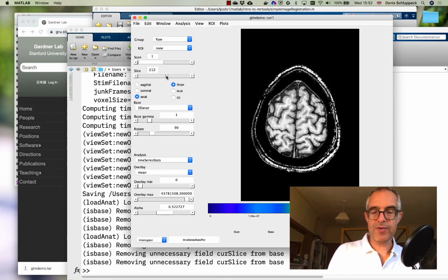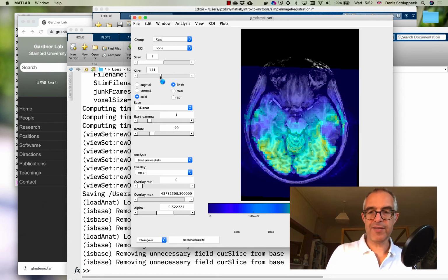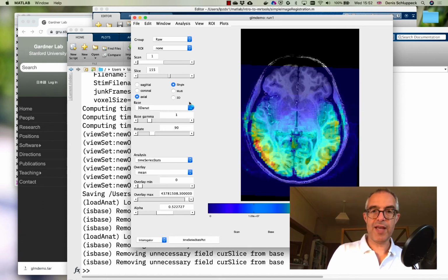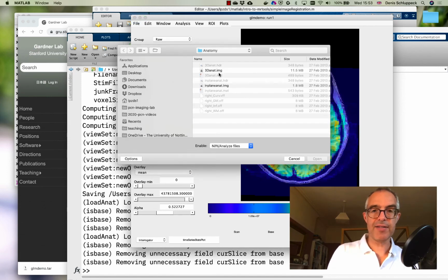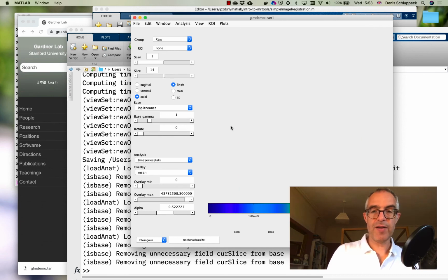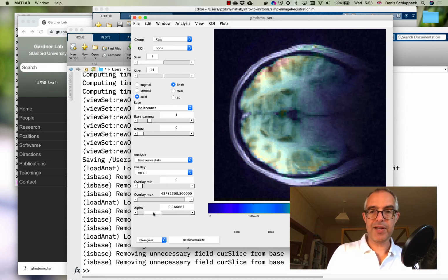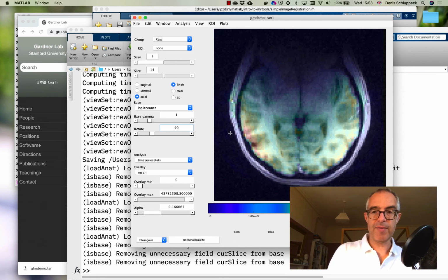So the question now is whether, when we perform the analysis with the GLM code, the resulting maps should be the same. In theory they get created in exactly the same space as the time series statistics, so they should really match. One final check here is to load in as another base anatomy the in-plane scans that were collected for this particular person as well. These are slightly higher res images in exactly the same slice prescription as the fMRI data. Once again, slightly odd orientations may be here for you to look at, but we can rotate these by 90 degrees and look at them maybe in this way.